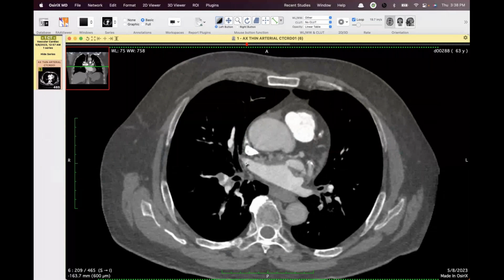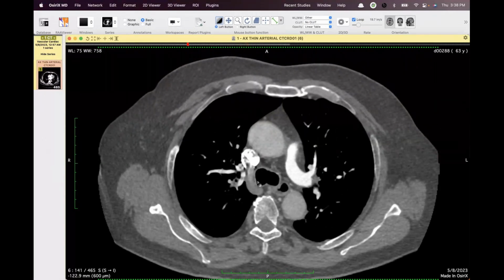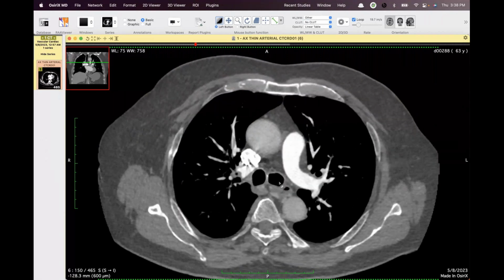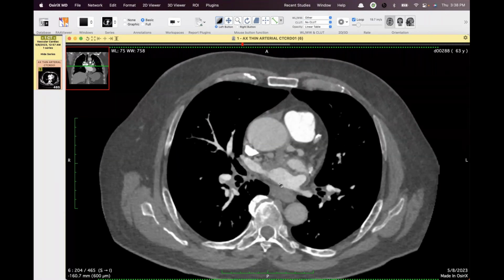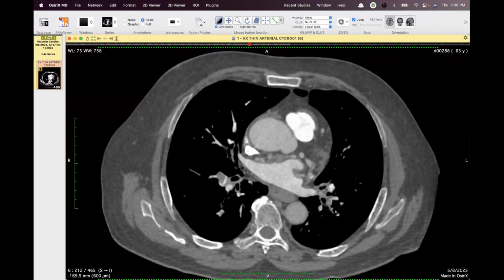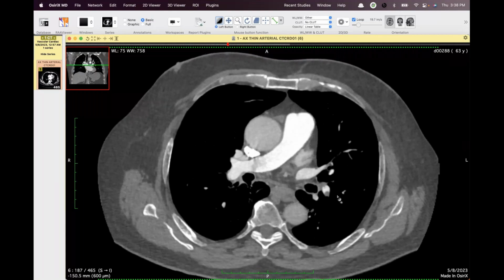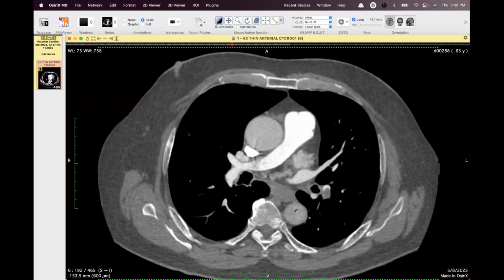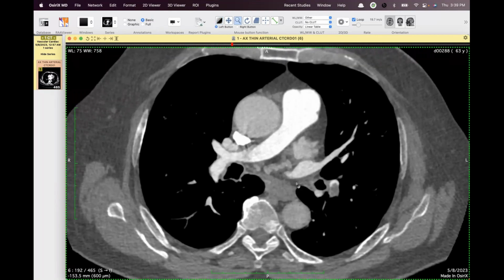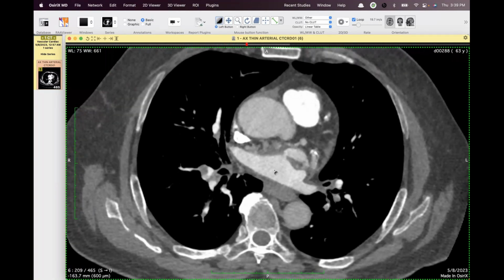Yep. Okay, so this is a case that a colleague shared with me the other day, 63-year-old. The acute pulmonary emboli that they have is not the diagnostic dilemma. And she called me. She was about to sign off the report after she had read it out, and she noticed just this big tangle of vessels in the mediastinum here, and was wondering if I made anything of it.